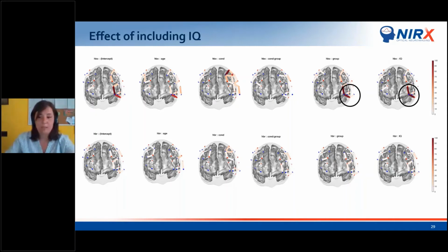So there is no effect of IQ. It's not possible because I simulated it. But since I manipulated it to have such a strong clustering, such a strong overlapping with the grouping, the model also thinks that the effect is partly due to the different IQ. And this is another problem, the problem of collinearity.